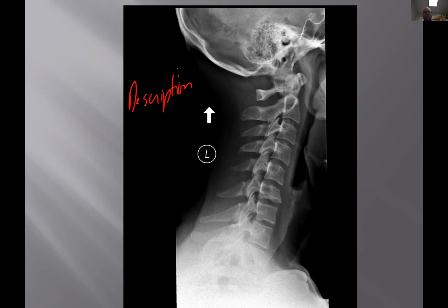I know that you want to, but I just want to remind you of the power of a good description and the power of observations right around this area. So find stuff that you might put in your description in the red circle that is associated with that main level right in here. All right, go ahead and go, and I'll write it down for you.